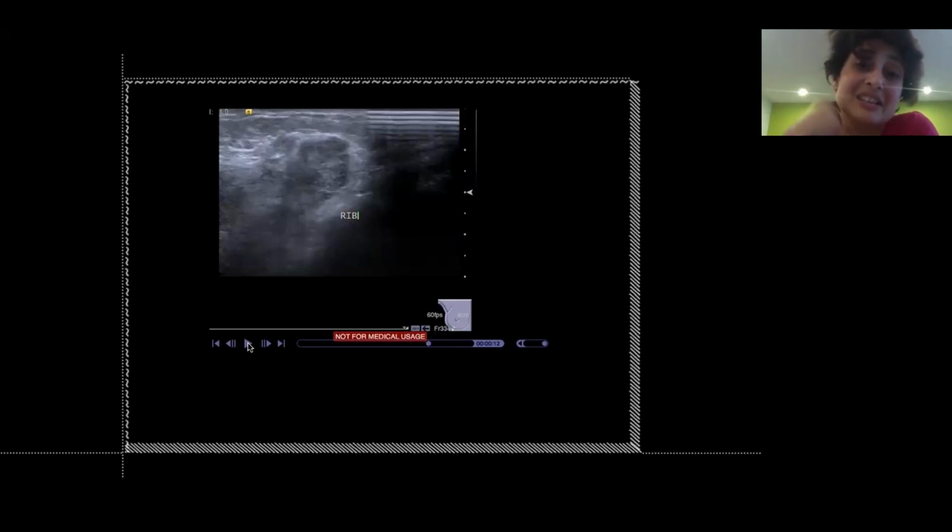Once they're taken, it's a bit difficult to interpret. But where you see something marked for you, it's a good thing to pick up on that and comment on it. There is a trend in the FRCR exams of asking for and putting in more ultrasound images. So good to use all the information that you have.